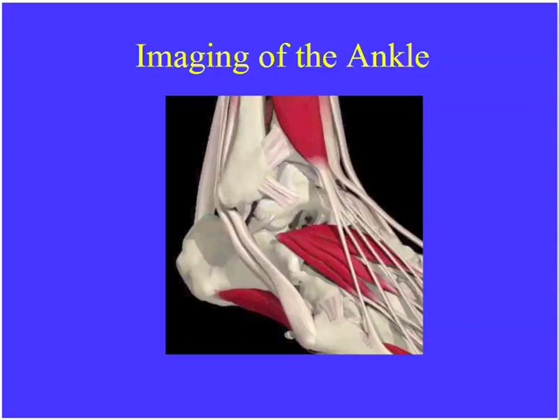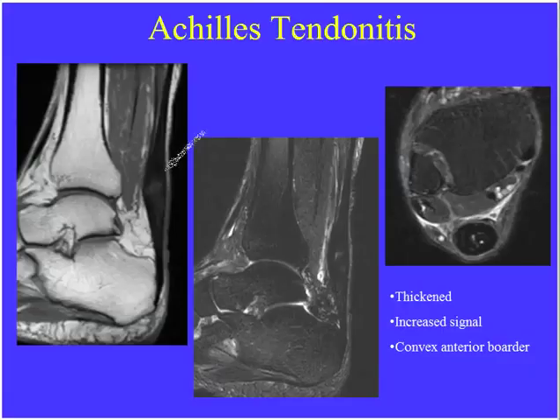Okay, we'll look just for a moment at the ankle, and we'll be wrapping up in just the next couple minutes here. The ankle is also a common place where they ask a lot of questions, and they like to ask questions about the tendons. We'll start out with the Achilles tendon.